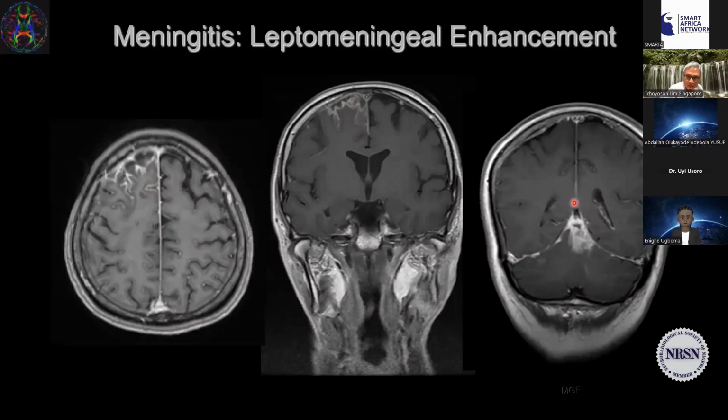And in this particular patient, and in all patients, the area of brain underneath the meninges is very susceptible to infection, cerebritis, and subsequently abscess. So this patient had leptomeningitis here and parenchymal infection. This is cerebritis, and if given enough time, uncontrolled infection will start to build abscesses here.